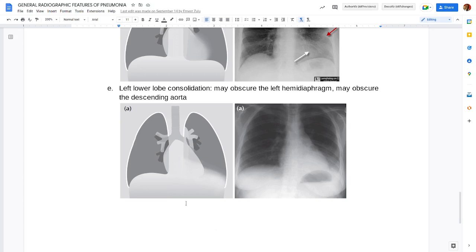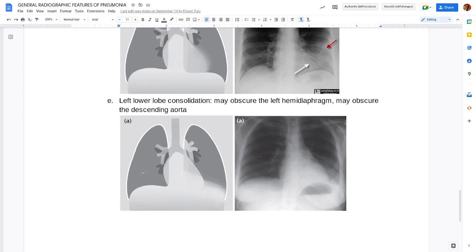That cone, which is shaded gray, that is the right lung. Now the lower border there, which is curving like a dome, where your cursor is, that is the diaphragm. That's the diaphragmatic dome.